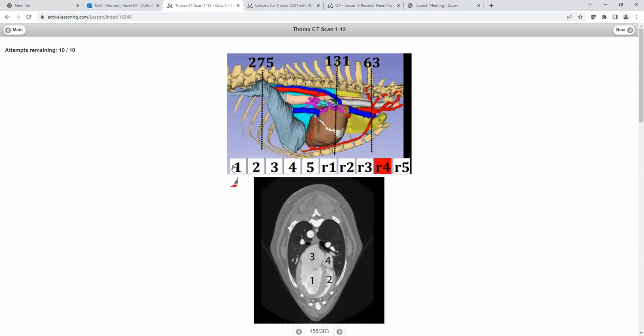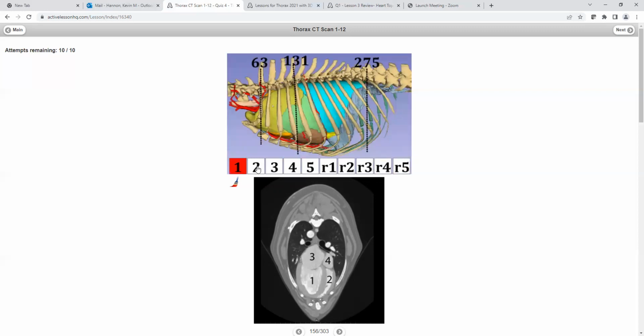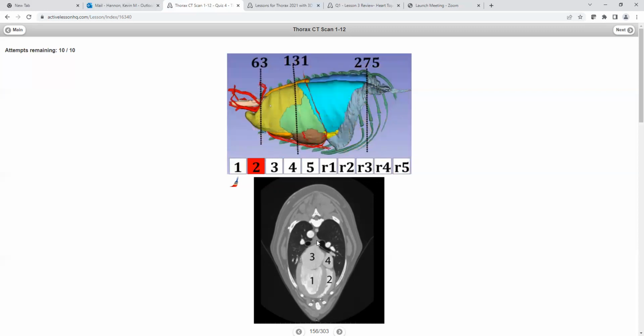So you've got to start with the big picture. Let's go back to our left lateral view and we get rid of the lungs. So these obviously are going to be lungs here as we're working our way superficial to deep and we're looking above. But what is this big structure right here that we're dealing with? Well, you're dealing with the heart. So first off, you have to say, okay, that's got to be parts of the heart. And this implements, so why are you doing CT scans?